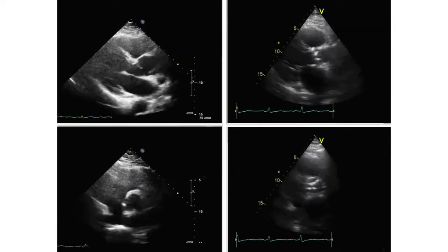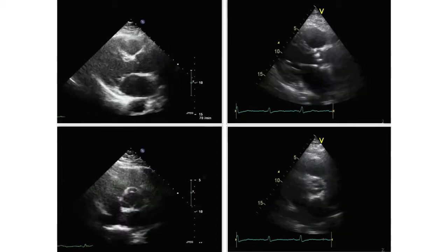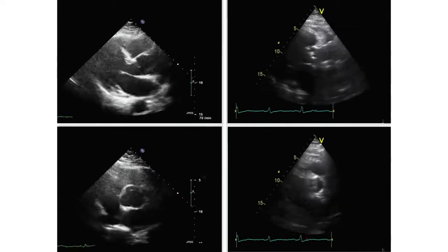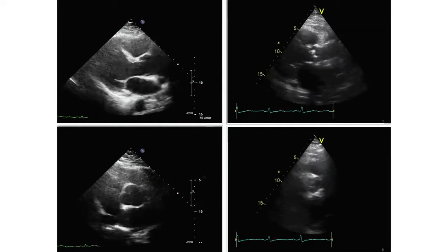So I propose we go through a test. Can you say which one of these aortic valves is a good one and which one is a bad one? This time we won't give you so much time, we want you to be quick. So just have a quick look. You can do it, it's really easy. You already trained your eyes.